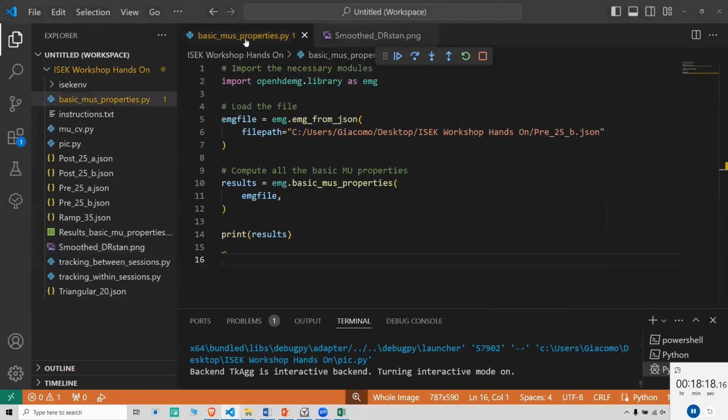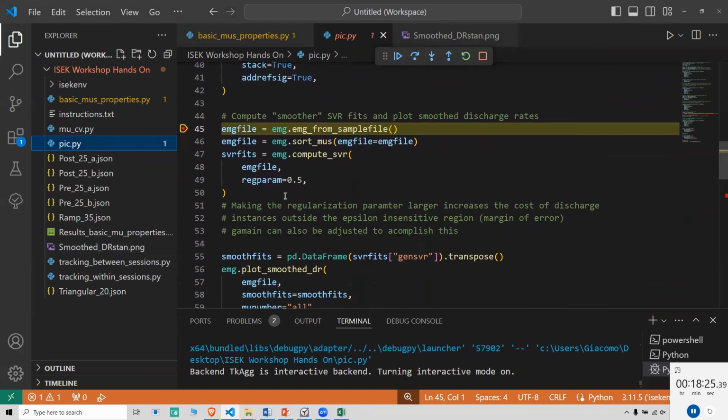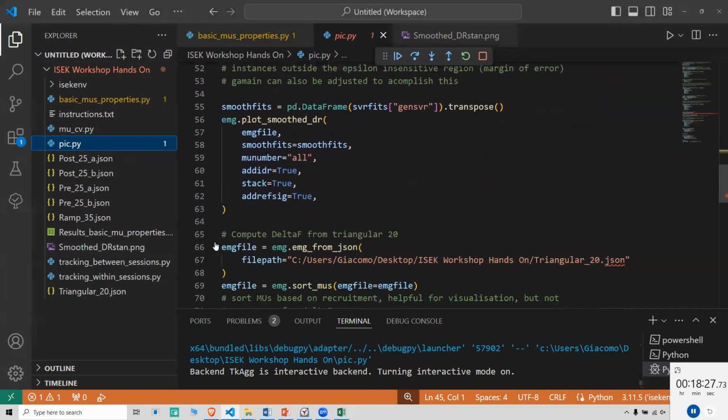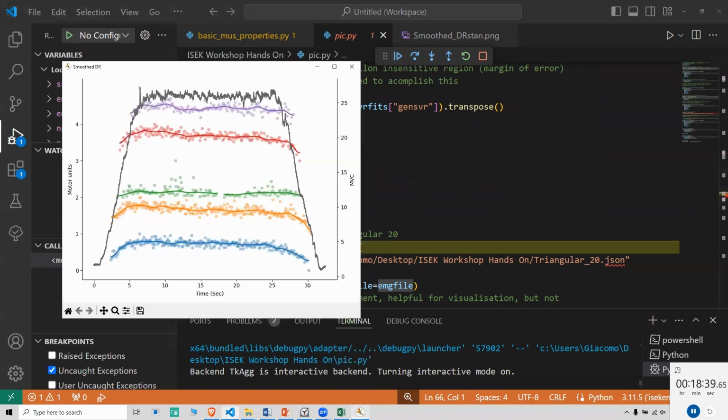Additionally, you can go the opposite way if that was something that you were interested in doing. Here we can make the regularization parameter smaller, so it'll do the opposite. We'll just quickly plot that so people can see. So here you can see that it's quite flat. This is not something you probably want to use, right? It's barely capturing the basic essence of it, but it is, in some instances, maybe something you're interested in doing.